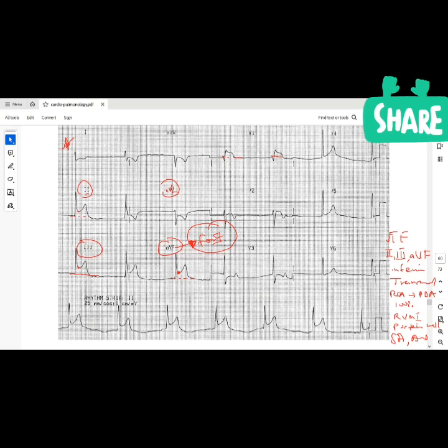Like 4? So this is an R wave, this is another R wave. Let me use those two. I have 1, 2, 3, 4, 5, 6, 7, approximately 8, but it's about 7 point something, 7.5. So 300 divided by, let's say 7, is equal to what?